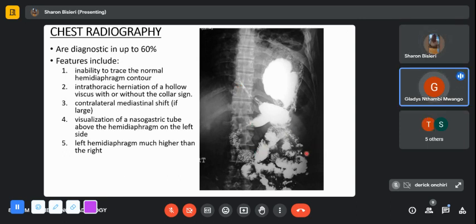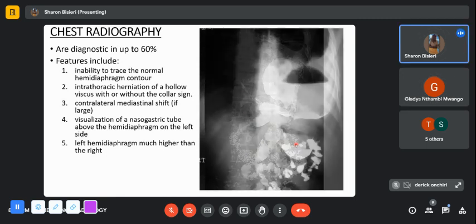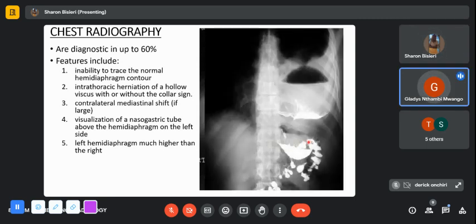Yes, the pattern, the mucosal pattern. So it is colon, the next image. So you have the transverse and the splenic flexure. It's quite a delayed image of a barium meal follow through. So there was hold up in the stomach.